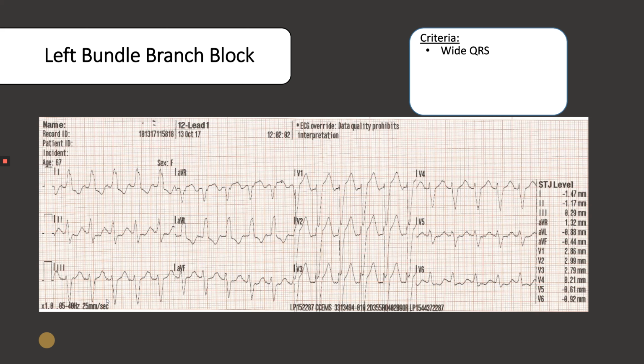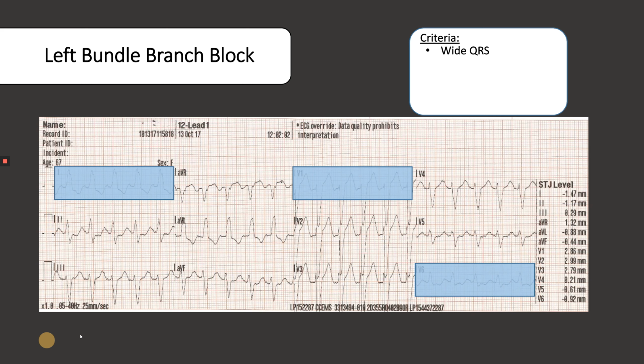Okay. It's not a ventricular beat. Ventricular beats are wide, but because the SA node and the internodal pathways and AV nodes are still functioning, this isn't a ventricular beat. It's a little bit different. Okay. Now, second off, what I'm going to do is I'm going to look at 3 different leads, and that's all that I'm going to look at. You can kind of ignore the rest for this criteria. I just want to focus in on these leads, to make your life simpler. The next thing I want to look at here is a monophasic R wave in lead 1. Monophasic R wave in lead 1. So I'm going to look right here, try to find a better color.